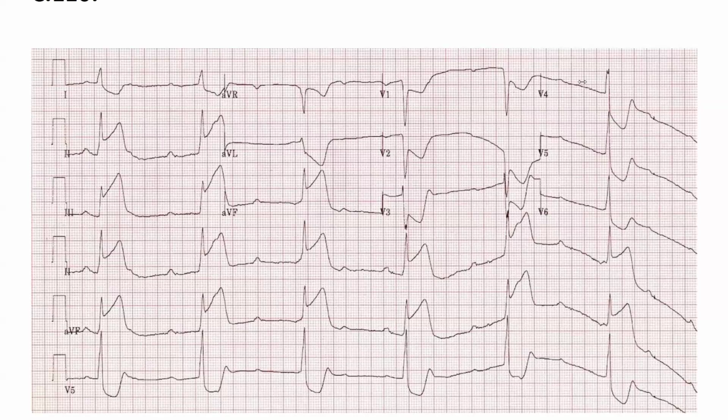The rhythm is regular. Yes, so it's rhythmic. Okay. Go on. There are P waves before the QRS. So we do have P waves. Yes, we do have P waves. Okay, you can see P waves. All right, that's fine so far.